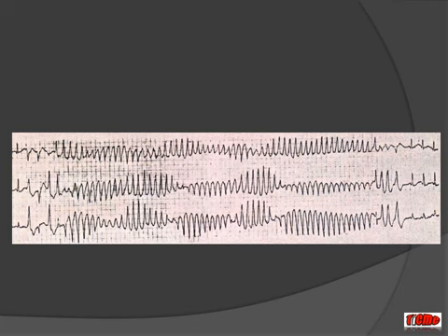And again, when we terminate our rhythm, you can see just how long the QT interval is. The T wave is finishing almost on the back of the next QRS complex. So this is classic torsade de pointes. Not only is there a twisting of the points, but there is also a long QT interval. Now the treatment of this rhythm is magnesium sulfate and cardioversion. Cardioversion by itself is unlikely to be successful unless you use magnesium in the long QT induced torsade de pointes.